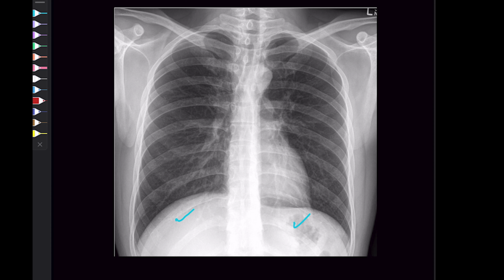So now for that, if you pay attention, can you see this area which is slightly darker? Can you clearly see that which is in between these 2 lines? That is my trachea. And we all know trachea is a windpipe. After that, can you see this area which is being very clearly highlighted? What is that area? That is my aortic knob or aortic knuckle. This is a term which is very commonly used by radiologists.